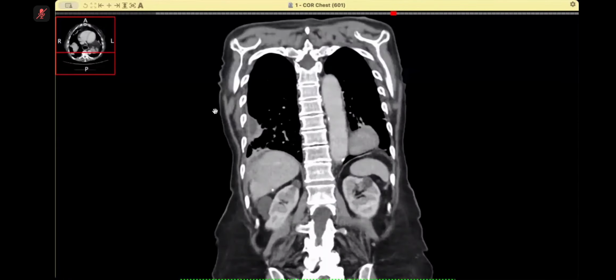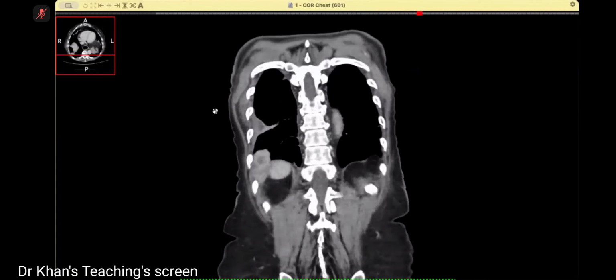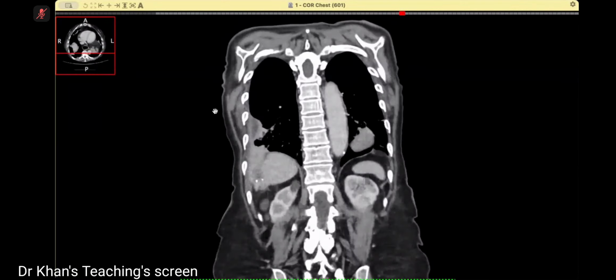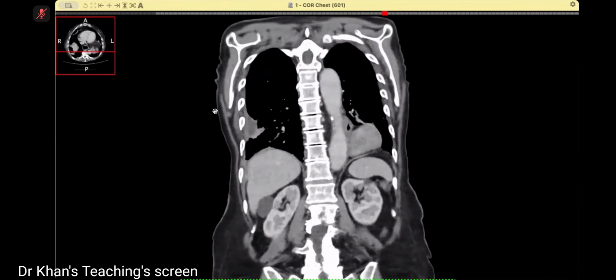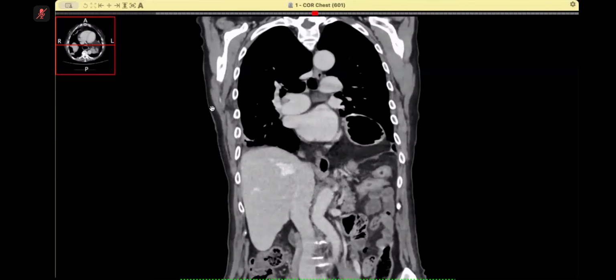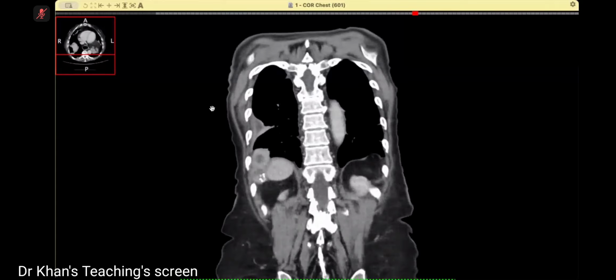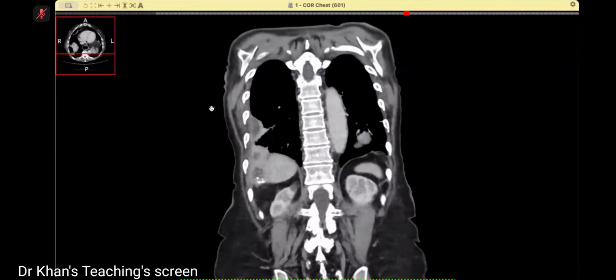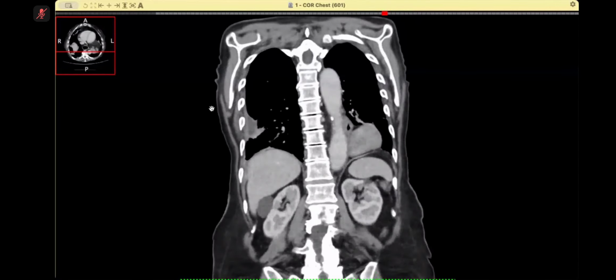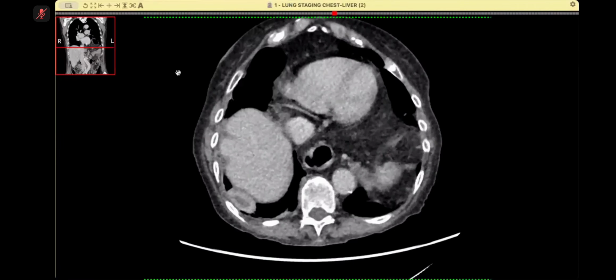As there's a recent history of cholecystectomy, I cannot appreciate any definite mural lucencies around this. So in my differential, it could be a case of a pyogenic abscess or, second, I would also like to keep the dropped gallstones while the surgery was taking place.